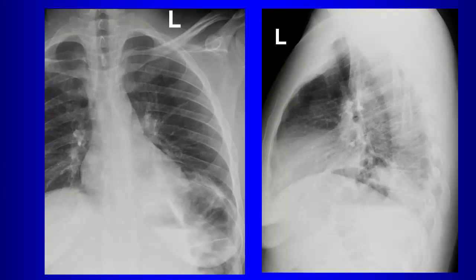So the one thing you described, you said the spine sign. For the spine sign, as you travel down the film, it should get blacker. This film gets whiter. That helps. What's another thing that helps on the lateral view? You lose the diaphragm. So you want to get in the habit on the lateral view of always looking for both diaphragms, okay?